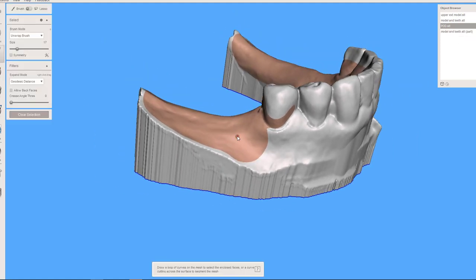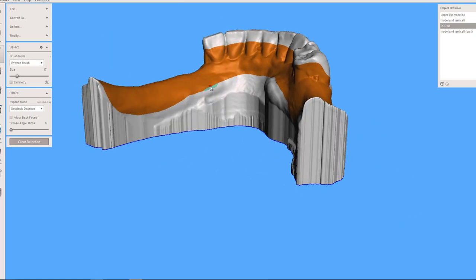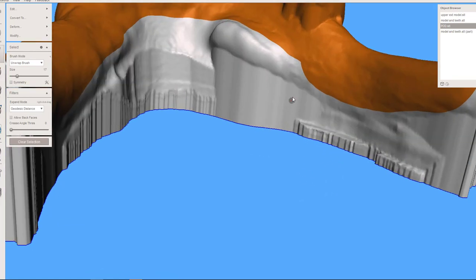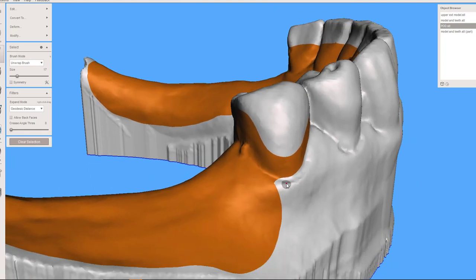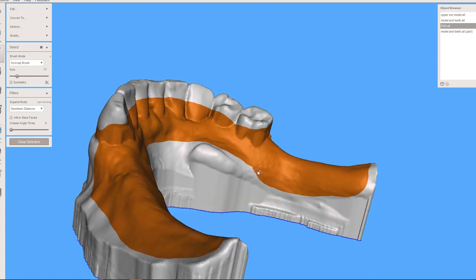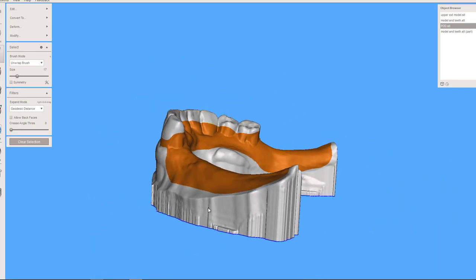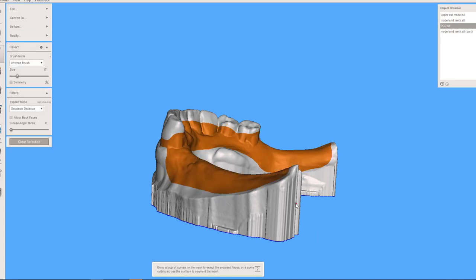So I'm going to take all this surface, I'm double clicking that face group, and let's see, a few little areas I want to smooth back up again. So just give it a good once over and make sure you like all of your contours. Again, this is easily adjusted. I might be nitpicking, but so be it. Once again, B, smooth it, accept that.